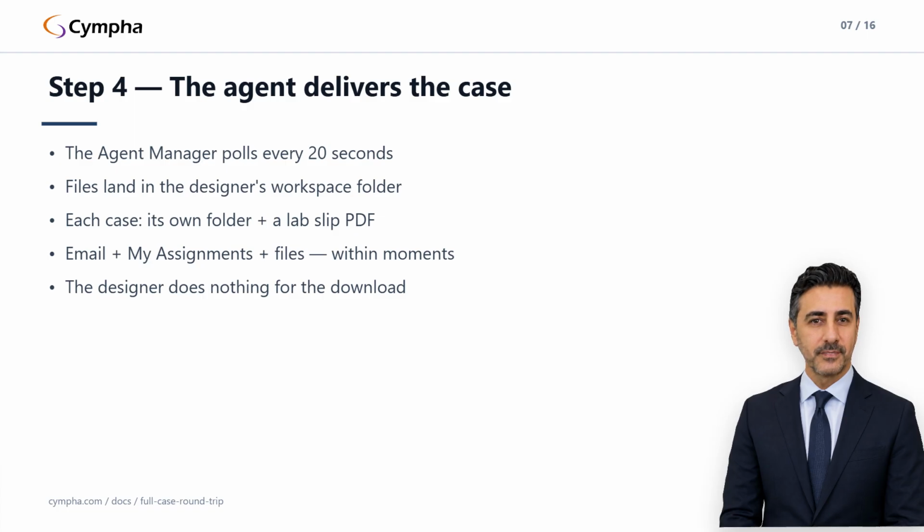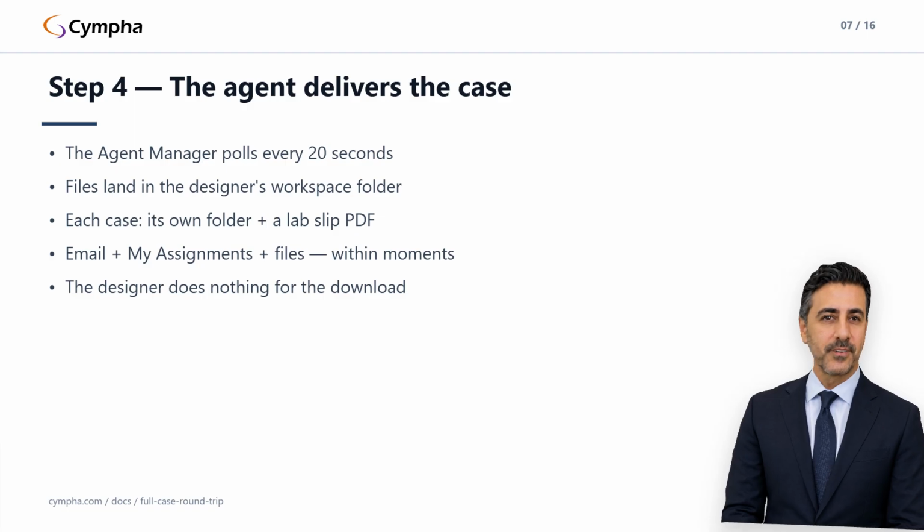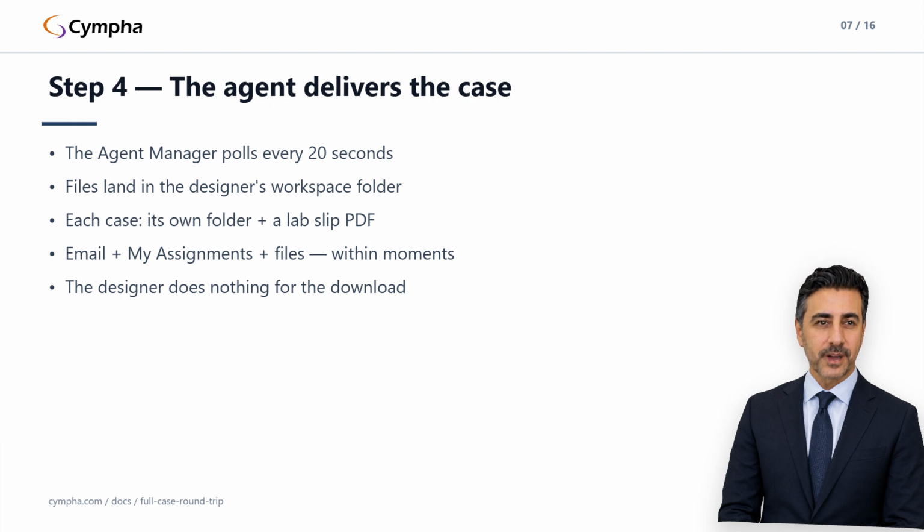Start with context. The designer opens the case bundle in Cympha Studio, in the browser, and note that Cympha Studio is a browser app, so there is nothing to launch from File Explorer. The case page links out to the Studio workspaces. Opening it brings back the clinician's assembled virtual patient exactly as it was built: meshes, volume data, photos, measurements. The designer never has to reconstruct the clinical intent from loose files.